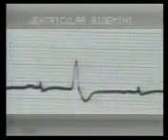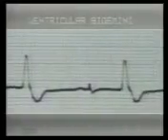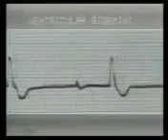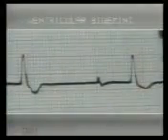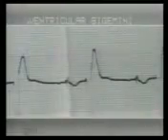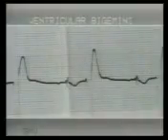This ECG shows alternate normal beat and ventricular premature beat. This is called ventricular bigeminy, where every alternate beat is a ventricular premature beat. Note the ventricular bigeminy. This is the same ECG in another lead. Note alternating normal beats and ventricular premature beats.